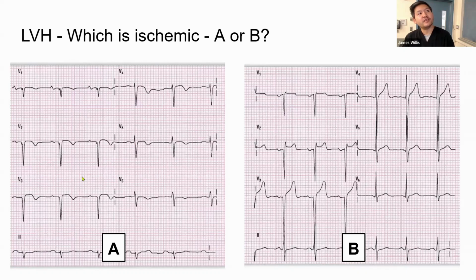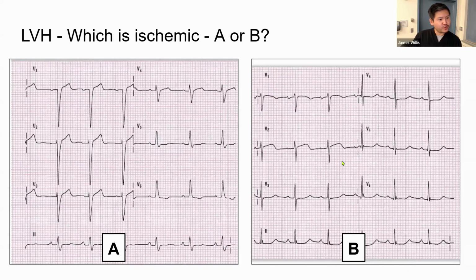Let's look at A. Are these normal T wave inversions for LVH? I don't even know if LVH is present here. It's not. So what's going on? Yeah, this looks like someone who had an MI. Maybe this is Wellens, but there is some elevation, so it's very concerning for an anterior, maybe a late presenting MI. Here to me looks kind of like LVH pattern as well. It's good proportionality. Do two more and then let you guys go.